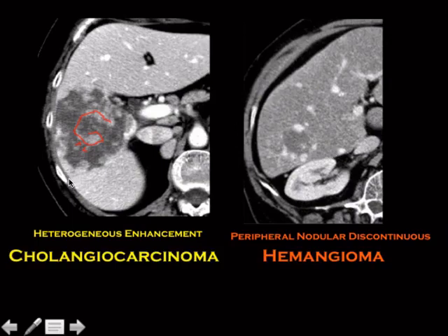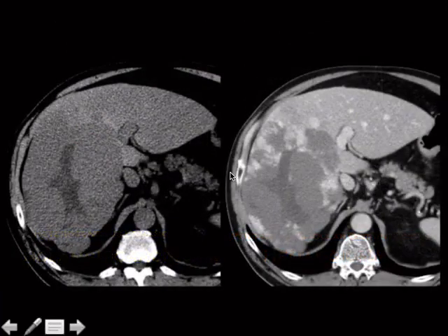Remember what I said also. You've got to look out for this right here. You get some capsular retraction in there. You've got to look out for that. But that would have been too easy if I showed you capsular retraction. I'm getting sneaky here. All right, so what about this one?